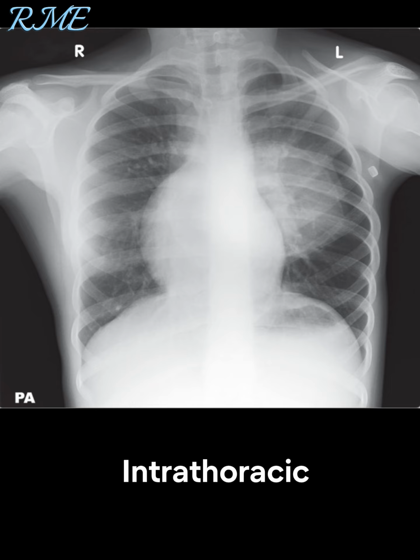All intrathoracic structures on the left side of the mediastinum are present and are clearly defined, although the mediastinum is shifted to the right. Otherwise, the lung fields are clear, although I note that there is increased transradiancy of the left lung field compared to the right.